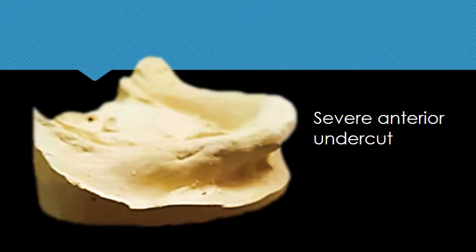By having relieved and lowered the front wall of the land area of the cast, we can now truly appreciate the amount of undercut that we have to deal with.